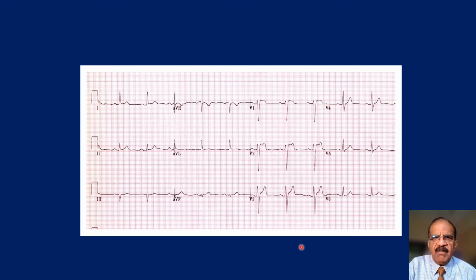Of course, there is some. That's why it is here. See this, V1 and V2. One, QRSs are slightly prolonged. Two, there is an abnormal wave at the end of the QRS complex, and there is ST segment elevation also.